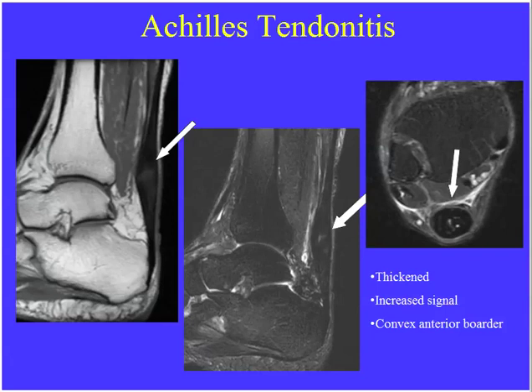And we see thickening of the tendon, and we see increased intermediate signal. We come over here. This is a T2 fat-saturated sagittal image. We see bright fluid representing some fluid within the ankle. So this is a T2 weighted image. Again, we see thickening, and we see areas of increased signal abnormalities. This is what chronic Achilles tendinosis appears like.